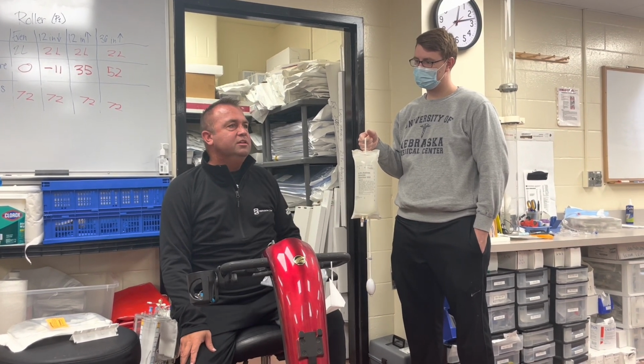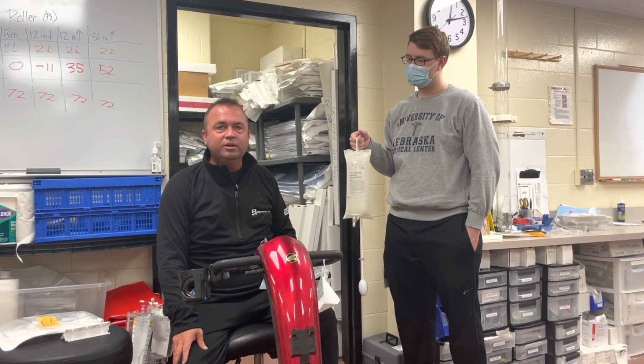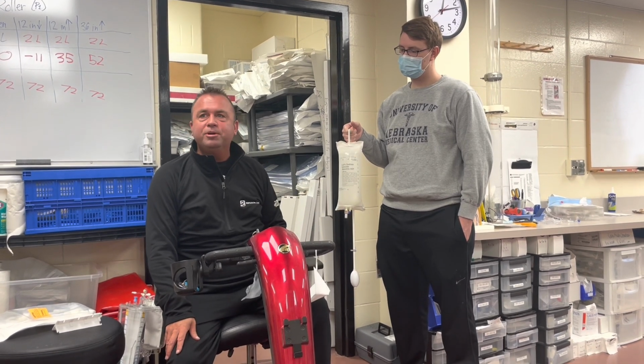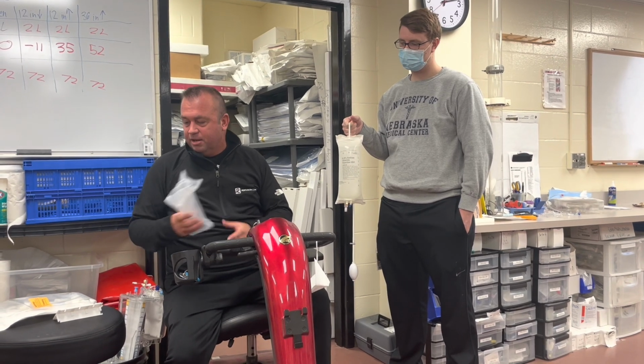Will it affect one like this with a pressure bag? Probably not. We'd have to have a pole that reaches all the way up to the 8th floor before we would overcome the pressure in that pressure bag or make any difference, right? So generally, once we have a pressure bag, the IV pole is not going to matter.